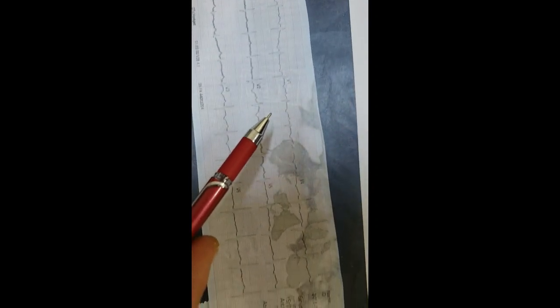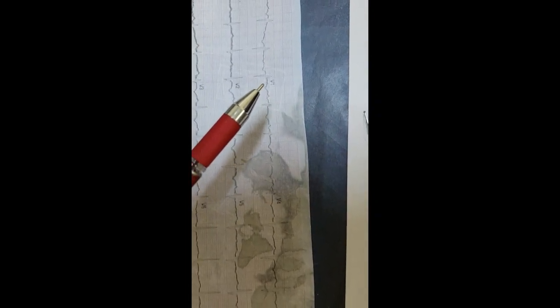This is another female patient with a pulmonary embolism, and the embolism is shown inside the right ventricle. This is V1, similar to that of lead 3, and this is V2, V3, similar, with a clinical presentation approximately similar to that of the first case.